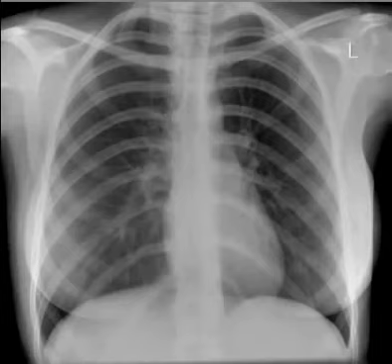There is a systematic approach and protocol to be followed, and this way you make sure that you do not miss any area and thus do not miss any pathology. Some radiologists will follow their own routine and will step by step look at the lung parenchyma, trachea, mediastinum, bony rib cage, cardiac size, retrocardiac area, height of diaphragms, costophrenic angles, cardiodiaphragmatic angles, as well as any avascular areas in lungs to see pneumothorax, and will also look for any mass or consolidation. This is done by assessing symmetry of grayscales in both lungs, and of course subdiaphragmatic areas are also assessed. Vascular pattern is also assessed. Lower lobe vessels in an erect PA view should be bigger than upper lobe vessels. Otherwise, patient may have cardiac problems.